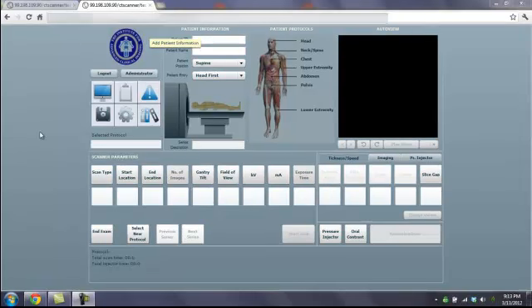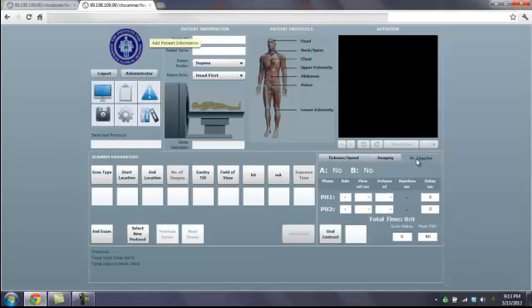Once logged in, you can see the main panel is laid out much like a CT scanner you'd find in a typical hospital. Area for patient information, patient positioning, an area for selecting the protocol that's going to be scanned, auto view to display the images, setting the scan parameters has an area for that as well. It has also an area, and this is unique to the simulator, where you can actually put the information in for the pressure injector. Commonly this is not included with the scanner.